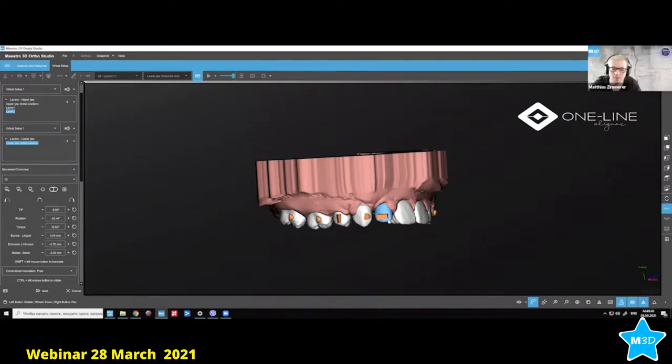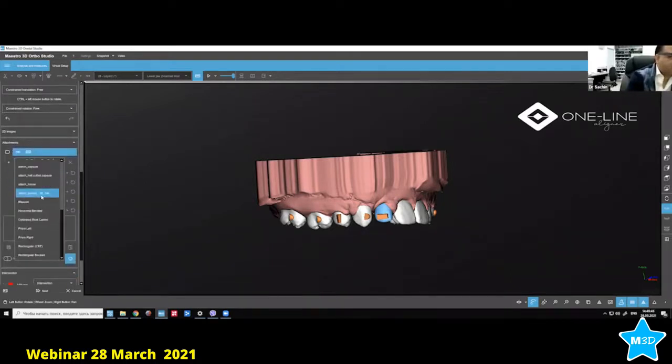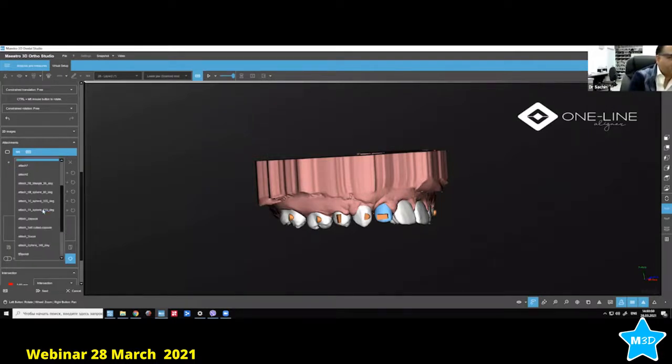Cool. So another thing which I wanted to show you was, so we also did a change now for an attachment.